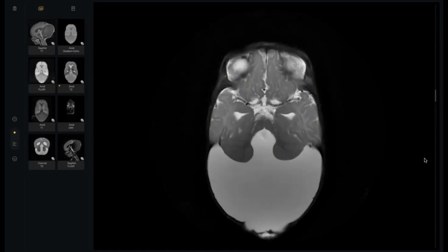Okay, in summary, in this patient, MRI of the brain of a child shows a large cystic area in the posterior cranial fossa at the foramen magnum, communicating with the fourth ventricle with vermian aplasia, and also hypoplasia of the bilateral cerebellar hemispheres. So my principal diagnosis is Dandy-Walker syndrome. Okay, what is your next step?